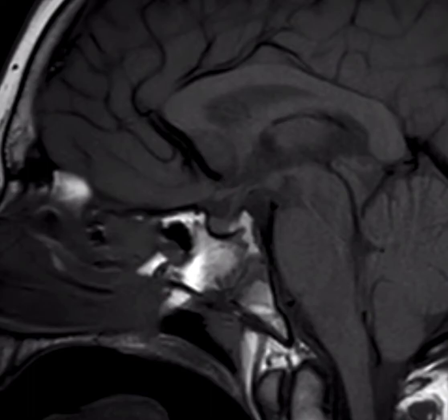This houses the anterior cerebral arteries, the flow voids of which are seen here, as well as the anterior communicating artery. The lamina terminalis ends down here at the level of the optic chiasm. The optic chiasm is the point at which the optic nerves cross and then continue posteriorly as the optic tracts.